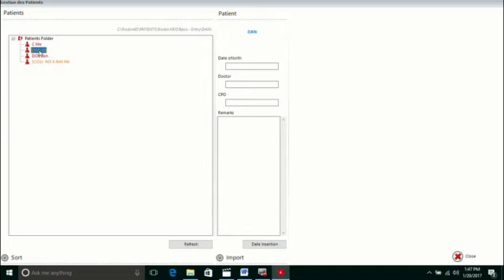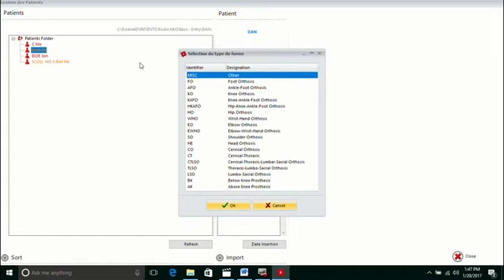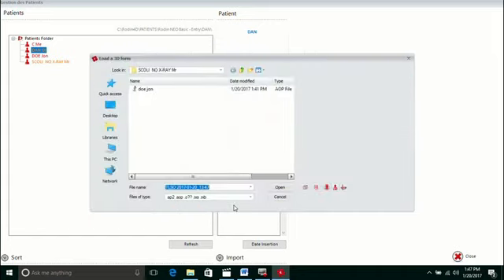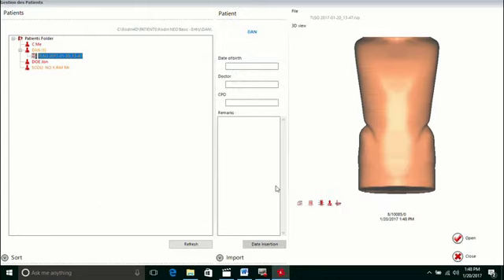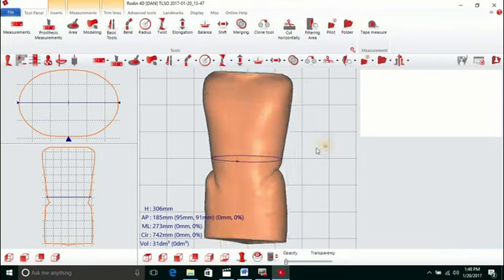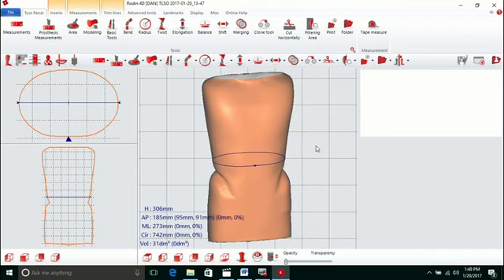So to import the AOP, I want to right click, new form library. Identify your model type. Click OK. Now we're going to browse for the AOP, and this can be saved on your desktop, can be anywhere. Select your model. Click on Open. Open again. Alright, that's all there is to it.